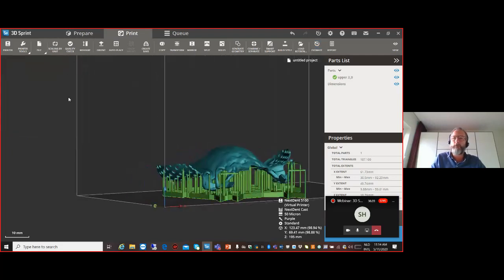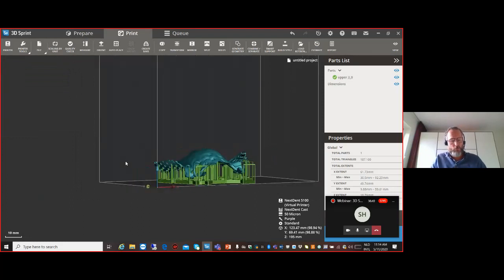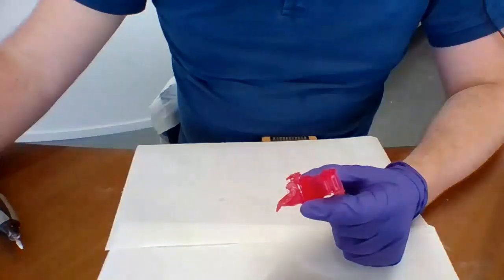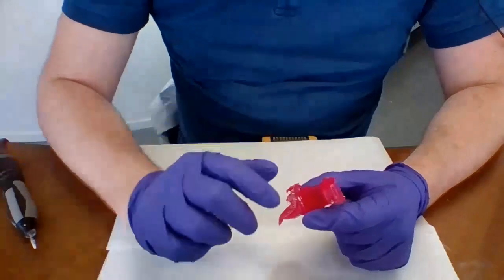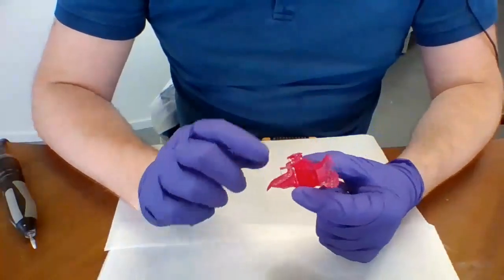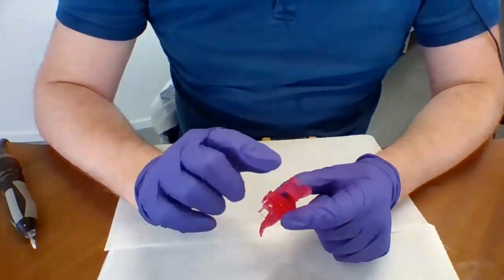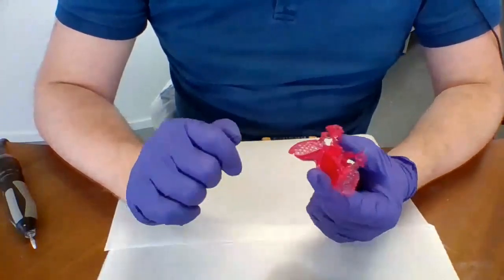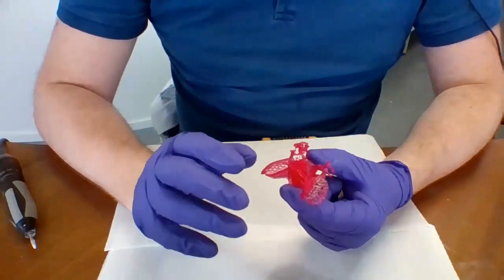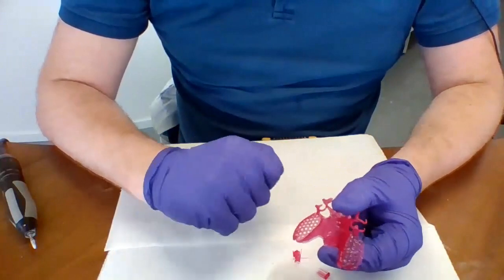To explain a little bit more in detail what that means in practice, we like to go back to Lars for a brief moment. Thank you, Menno. Again, here I have some cast parts in my hand. I actually printed them just now. The supports on cast are so small that you hardly have to break them away.